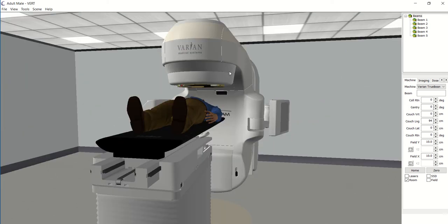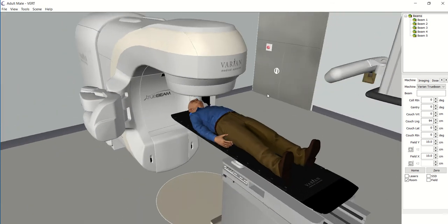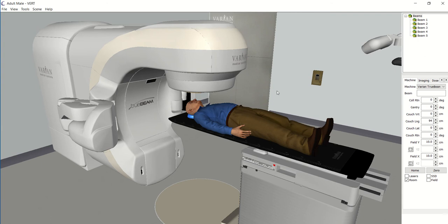I'm part of the Radiotherapy and Oncology lecturing team, and you'll have quite a few lectures with me within your first year. So this is just a quick tour of our virtual reality software that we use throughout your 3 years on the course.